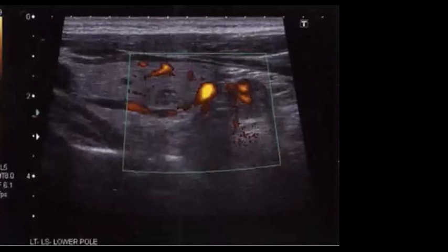I think we took this case before, so maybe I will exclude it. Yes, I will just skip it. Sorry. I think we showed it last time. Let's check this image, which is an easy case.